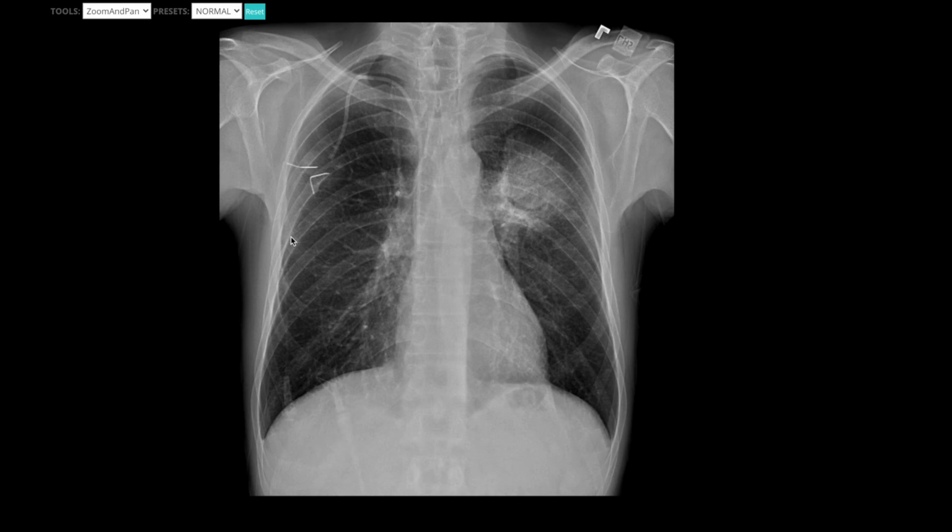Sometimes you just see this low level, diffuse opacification, either unilaterally or bilaterally. Imagine that the effusion is going to go all along the back. It's in the pleura, in between the visceral and parietal pleura. There's that potential space where the fluid is just going to be collecting, and it's going to be sloshing around. When they lay down on their back, it's going to go all the way along their back, kind of going up and down. So it's not just going to be dependent in this location. It's dependent here when you're upright, and sometimes when you're semi-upright, or even when you're supine. Sometimes it's difficult to tell whether or not there's effusion, but the simplest way to answer is to look in the costophrenic angles and see if there's any blunting.